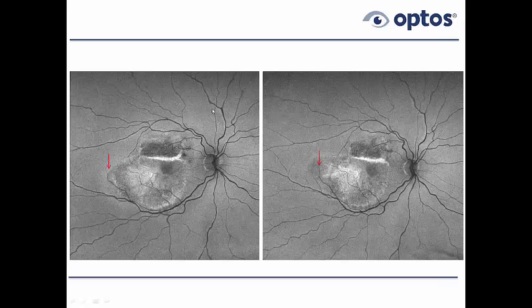Of course, we're going to do anti-VEGF in these patients. This one was treated within 24 hours in the affected eye, and he's actually been treated a couple of dozen times since over the last year and a half or so. Of interest, we can use OCT, but also ultra-wide field autofluorescence to show us change in these cases.